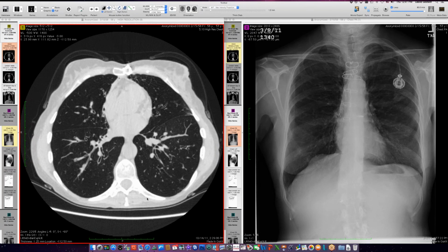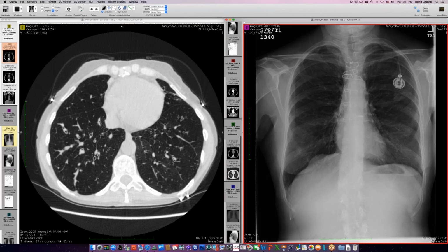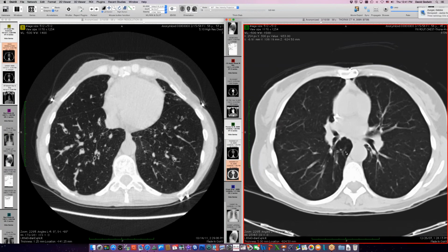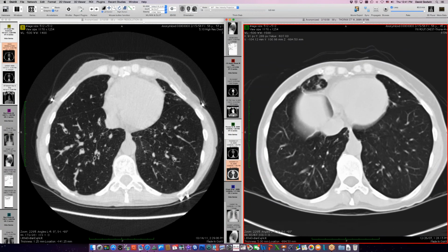And this is obviously post-op, so we have the sternotomy. Let's go back to an earlier one. That's in 2011. So this is 03 with a port catheter in place. If that's for sure 03, then I think it's a different one. It looks as if there were already nice bronchial findings. Would you like me to send you your case? Yeah, send me his case too, because this is quite unusual, and I'll make sure it's the same one. But the one I just showed started in 2011, I think, rather than 03.